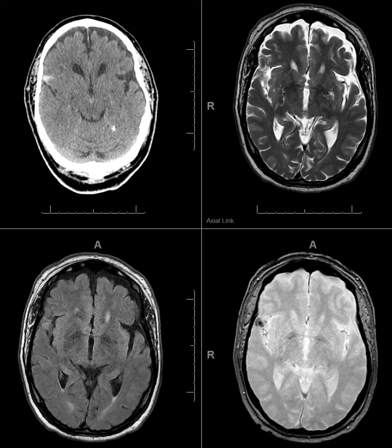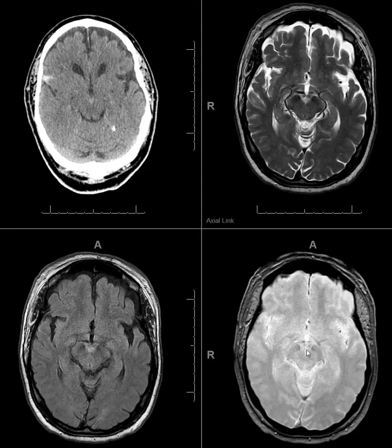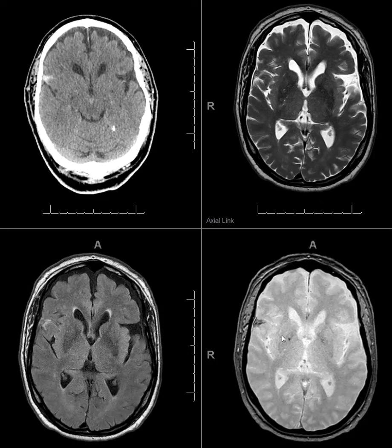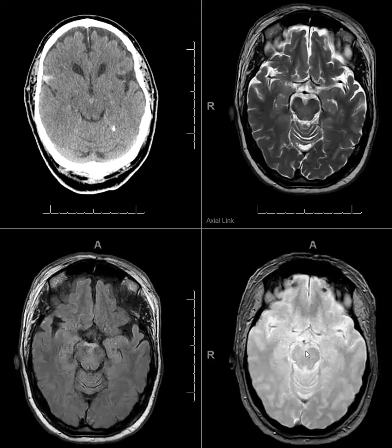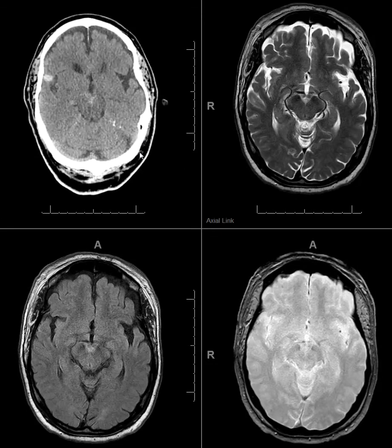On gradient echo images, you can see the hemosiderin in the sylvian fissure, the hyperdense region, the more clotted portion, has the hemosiderin, and in the prepontine cistern, you just don't see that blood product well. So you just cannot say that without seeing the hemosiderin, there's no blood. So sometimes the CT, and many times the CT, is more sensitive.